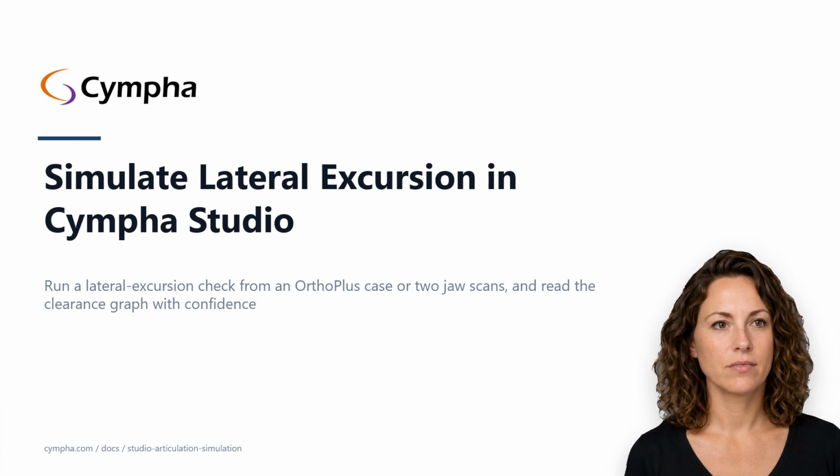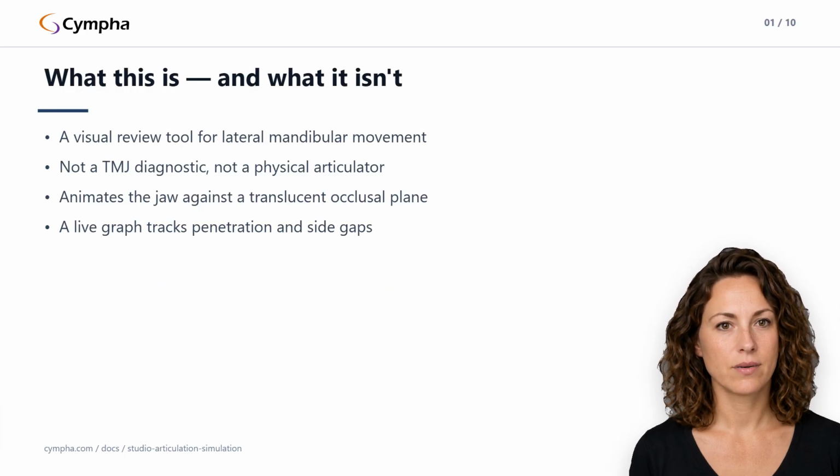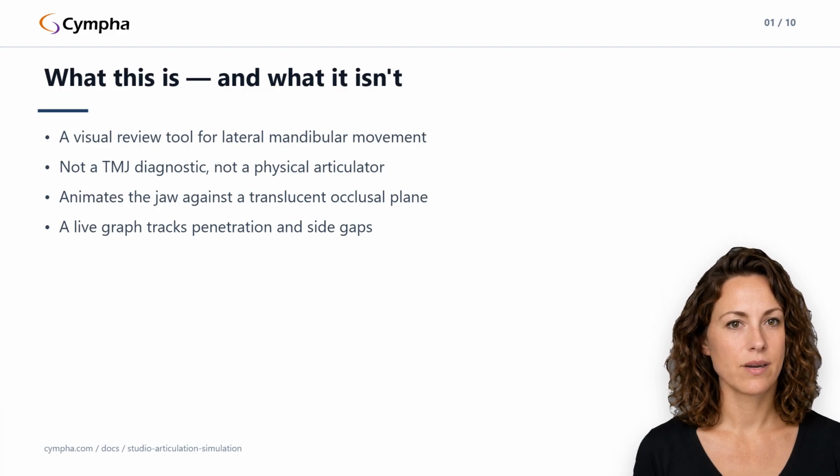Set expectations first, because this tool is honest about its scope. Studio's lateral excursion is a visual review tool. It is not a TMJ diagnostic, and it is not a substitute for a physical articulator.